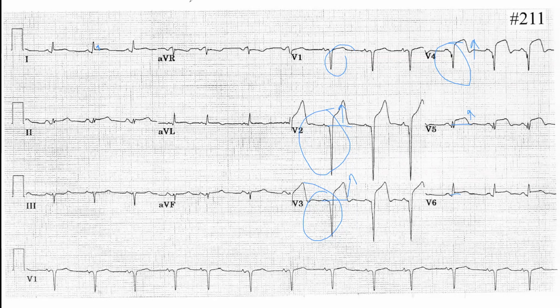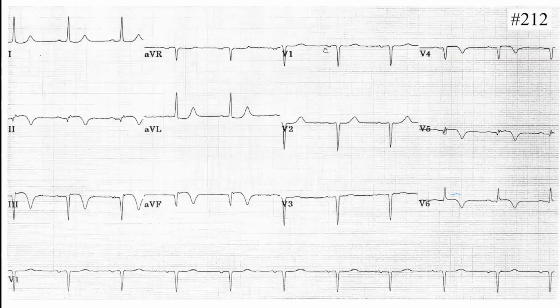Yes, an acute anteroseptal MI. Yes, correct. And again, there's no sign of hypertrophy in this ECG as well. Okay, good. All right.